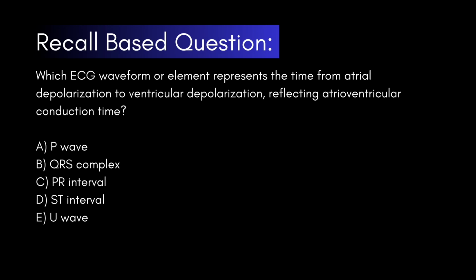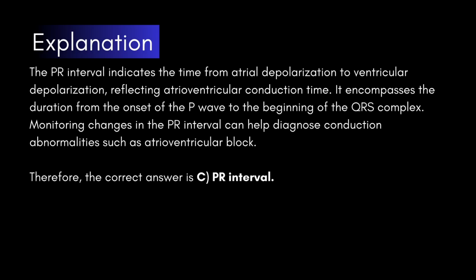Alright, I think I gave you guys enough time there. If you need more time, please feel free to pause the video as always. Moving on now. The PR interval indicates the time from atrial depolarization to ventricular depolarization, reflecting atrioventricular conduction time.